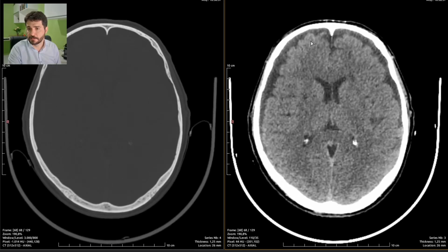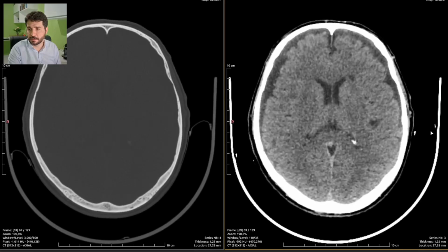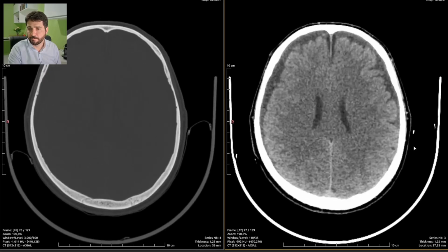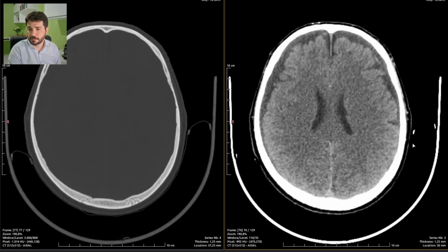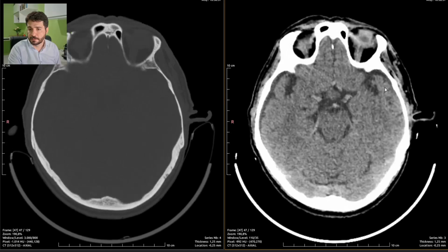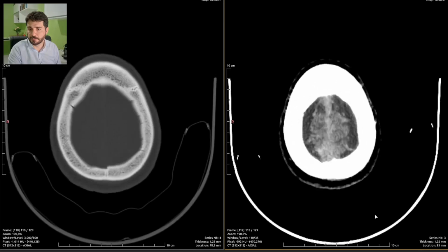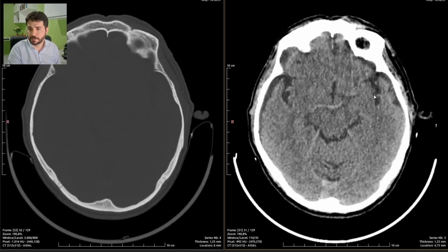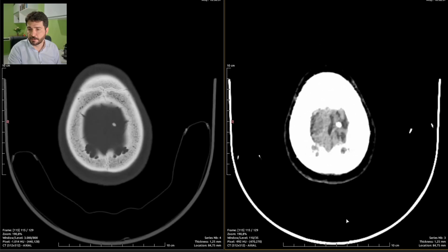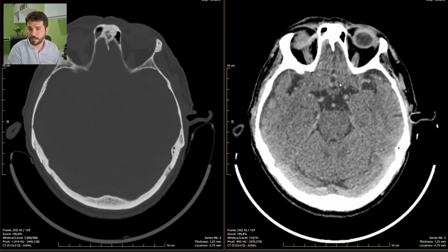So let's see the brain parenchyma. Those of you who are experienced have already seen the problem we have to report. I'm just rolling the images and letting everyone analyze calmly, with ease, enjoying the images to finally realize what's causing this patient any brain disturbances. So this is a quite preserved brain for his age.